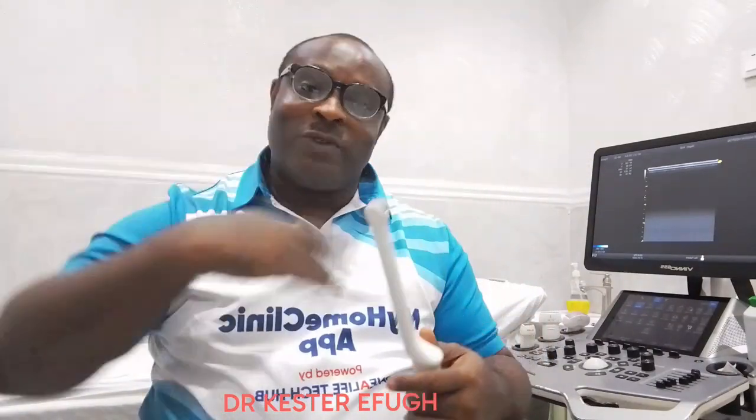Now let's talk about endocavity probes. Endocavity probes are probes that are put inside the body. So in transesophageal echo, we have an endocavity probe that is put into the esophagus. For transvaginal and transrectal ultrasound, we have the endocavity probe, which we can use for both.